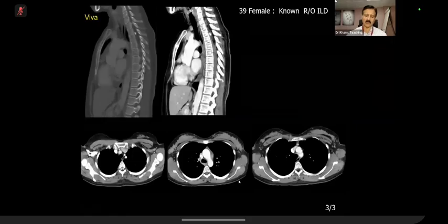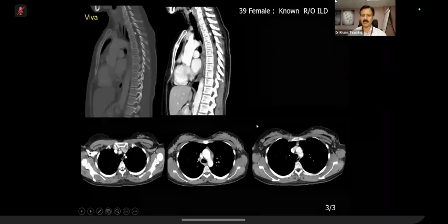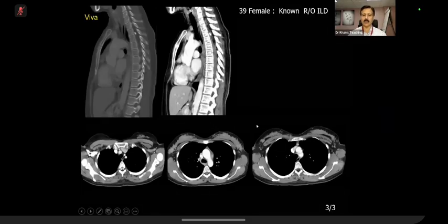Please remember, they have shown a case of diastematomyelia on a CT scan. If I show you diastematomyelia on an MR, a child can pick it up. It's too easy. So that is what this exam is about: unusual presentation of a common finding.